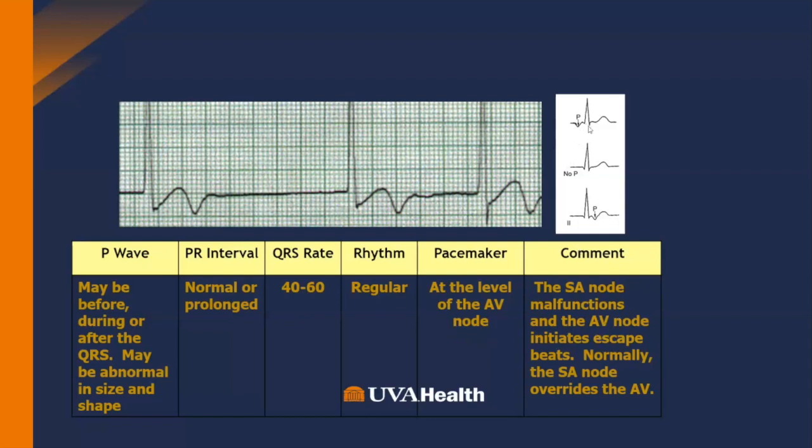So here's what happens. The P wave is retrograde. Remember, let's talk a little bit about conduction to understand what retrograde means. That means typically it flows from right to left or left to right. When you look at conduction, there's a distinct flow pattern of the electricity. Retrograde means that the beat is originating in the AV node and it travels backwards up the pathway.